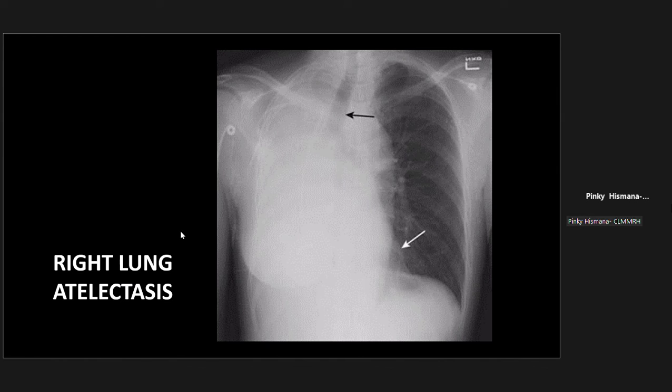Can you point out where the heart is, Doc? Fluid, Doc. If this is fluid, actually, the trachea wouldn't be in such orientation. I am showing you this image just to show you the importance of the appearance of your airway, as it will help you clinch the diagnosis.